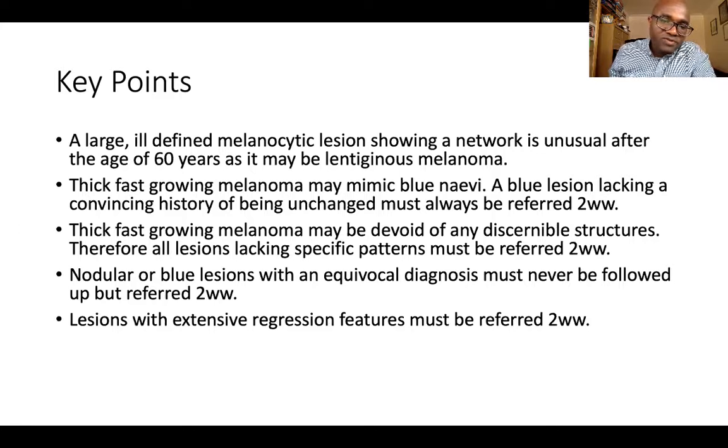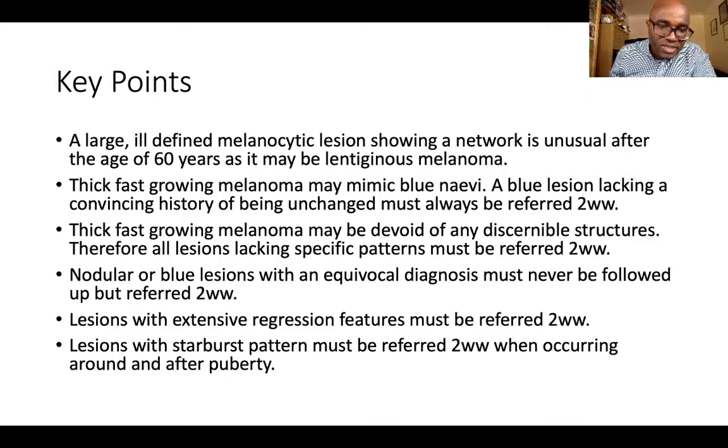Lesions with extensive regression features should always be referred on a 2-week wait. And again, a lesion with a starburst pattern, which is invariably a Spitz nevus, must be referred on a 2-week wait when occurring around and after puberty.